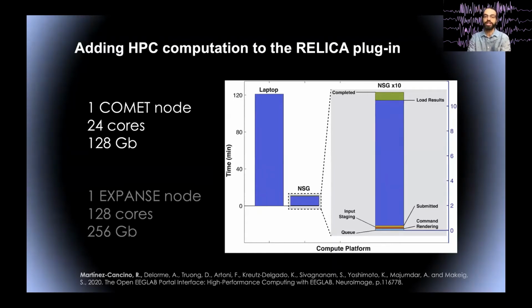You have 64 cores. And here MATLAB has a big advantage because it's very easy to do multi-core analysis in MATLAB. When you're looping over your subjects, you just replace your for loop by a parfor loop. So the for you replace by parfor, and it's automatically parallelized. It detects how many cores are available, and here, for this study, we had 19 subjects, so each core is going to process one subject automatically.